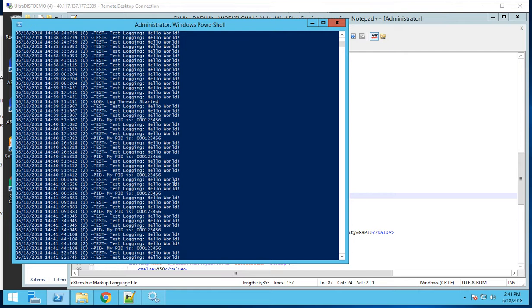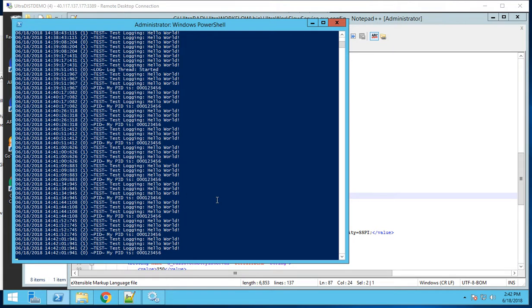And you can see here it's actually running. It wasn't updating on this side. Every once in a while you have to hit Control-C, because it sometimes gets locked up. But you can see it's outputting my patient ID, right? So we have it right there. So the script is working.